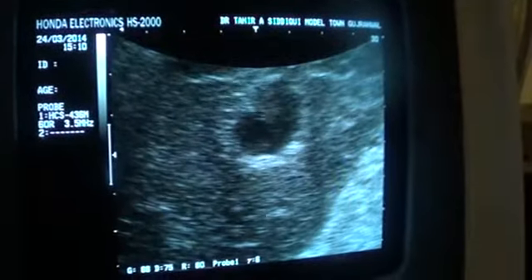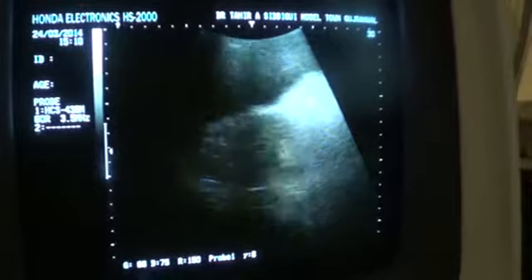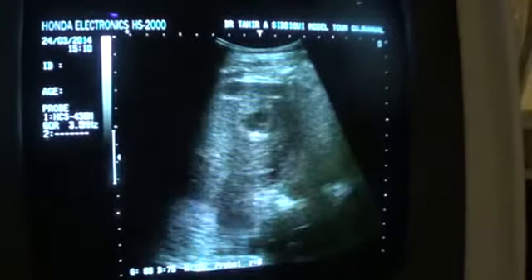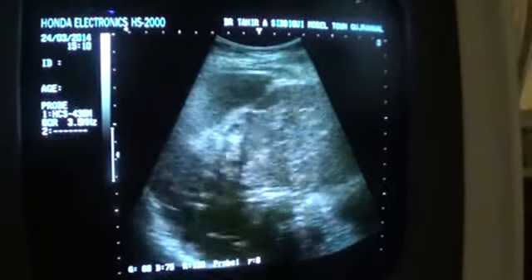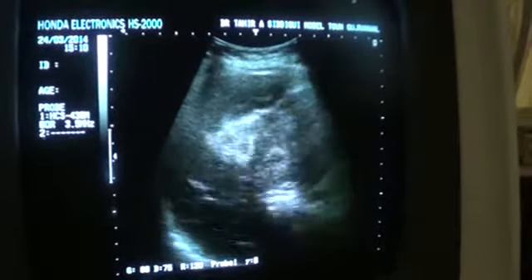And when the liver is cirrhotic, you see such cystic areas. Now it can be some necrotic focal mass lesion, and that it is. So there is a necrotic focal mass lesion seen.